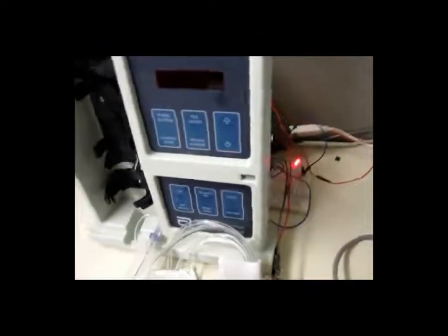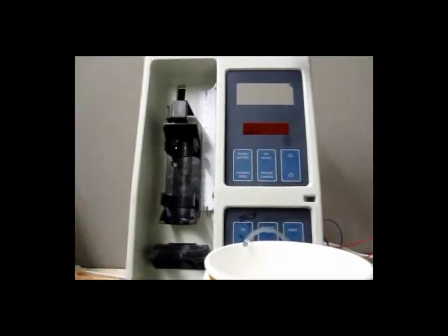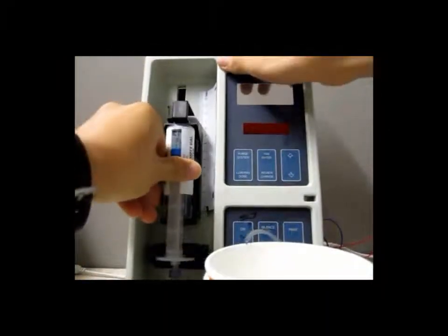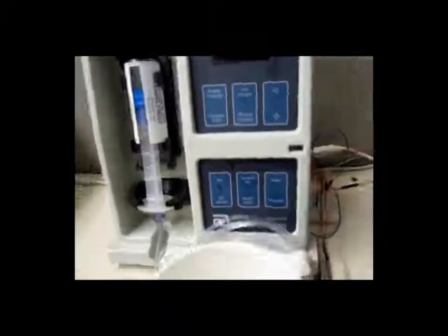This scenario shows that the syringe-loaded condition is detected through a sensor attached in the syringe slot. When using such a sensor, a software routine should interact with the sensor to deal with the alarm.